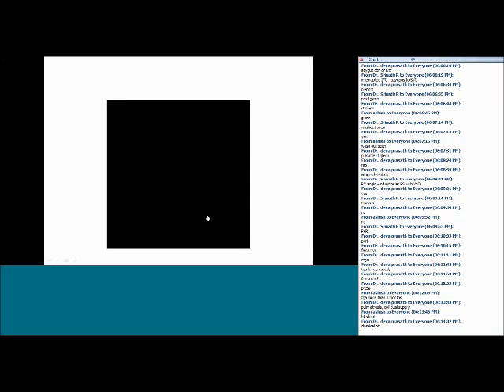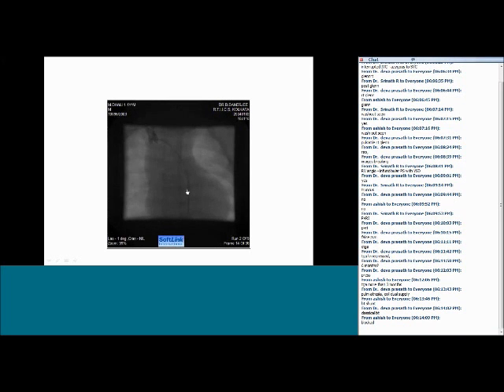No, it is not a classical BT shunt. You can't see the branch PAs, right? How can you all call this a BT shunt? Blocked. That's the correct thing. There is a BT shunt which is blocked. That's the correct diagnosis. So you can just see the stump of the BT shunt, isn't it?